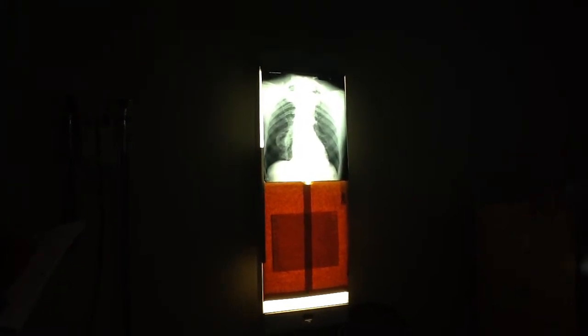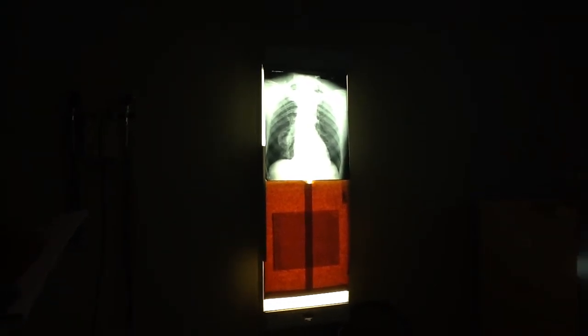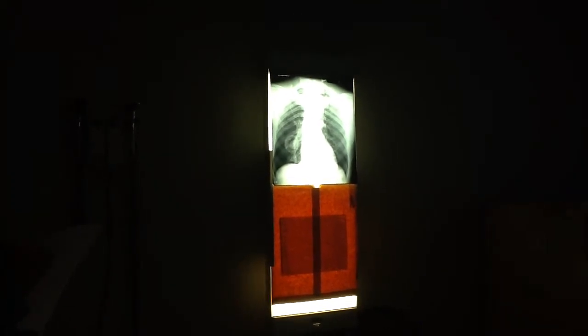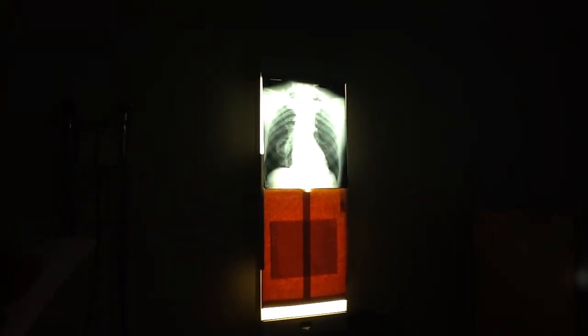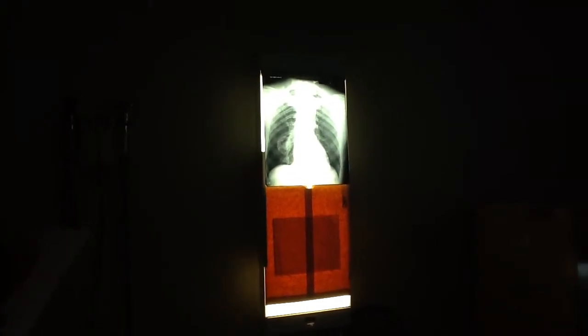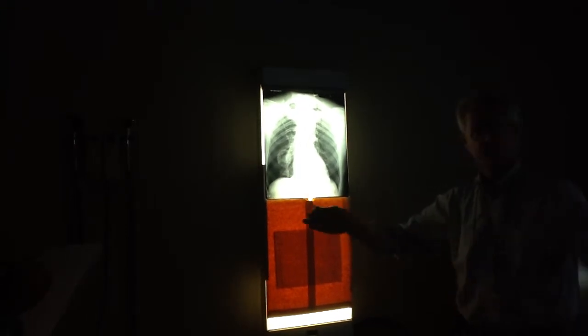Now, where is it localized to? All I can say from that view is in the lower half of the lung. What segments could it be in? 7, 10, and 5. Yeah, it could be in 5. And it's far enough lateral, it might even be a little bit of 4. It could be in 7, might be a little bit of 8. Could be in 10, might even be a little bit of 9, because it's going a little bit beyond the middle of the lung. But yeah, I think mostly 5, 7, or 10, exactly.